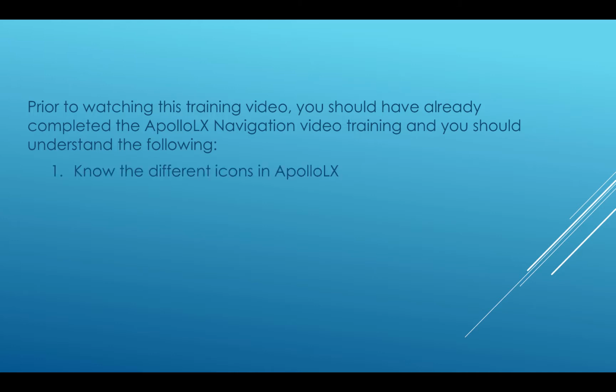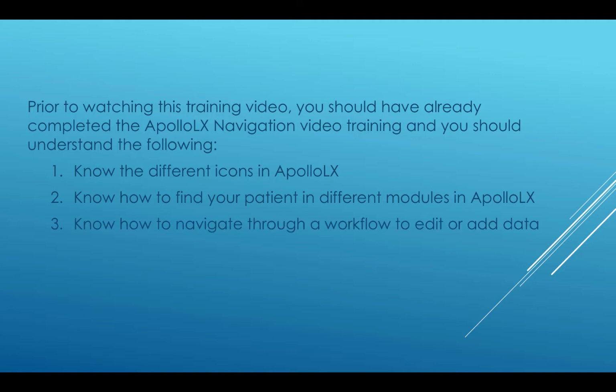understand the following. Know the different icons in Apollo LX. Know how to find your patient in different modules in Apollo LX. Know how to navigate through a workflow to edit or add data.